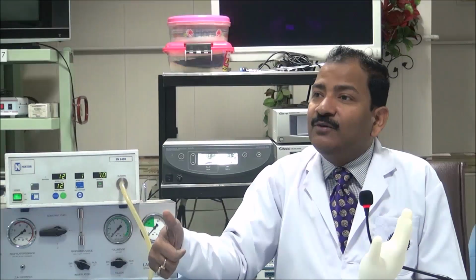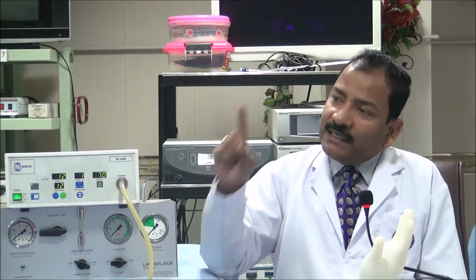There is none of the insufflators in the world which is manual. All are automatic. And the advantage of fixing the maximum flow rate to less is that your complication will decrease. Here, I cannot manually adjust the flow. It is fully automatic. And maximum flow rate will be decided by the amount of leak.